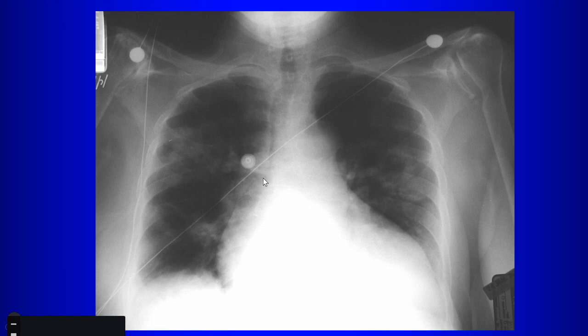Is this unilateral disease or bilateral? It's bilateral. You have bilateral disease affecting the joints with erosions, right? The changes in the distal clavicles. So it's a classic appearance of rheumatoid within the joints. And so then you might suggest that these cavitary lesions in the lungs represent what? Rheumatoid nodules, or necrobiotic nodules.